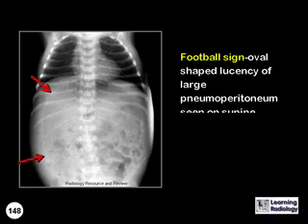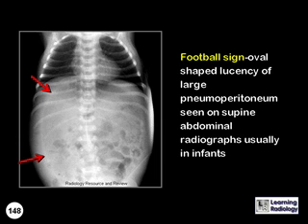What is the name of this sign? This is the football sign, the oval-shaped lucency representing a large pneumoperitoneum seen on supine abdominal radiographs, usually in infants.